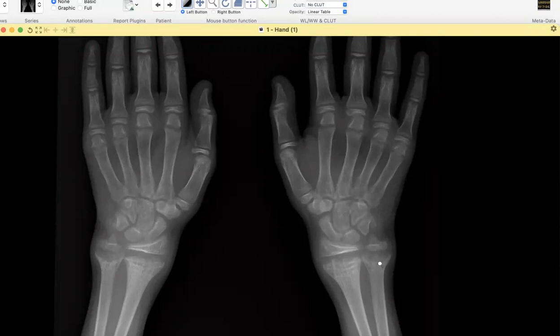And together, these are quite specific and characteristic. They give you only the diagnosis of rickets. I'm not convinced there's anything in the metaphysis of the metacarpals over here. Metacarpal heads also, I think you said. So the differential that you can put over here is that of scurvy. Scurvy would also cause metaphyseal widening. However, the mineralization in scurvy would still be there.